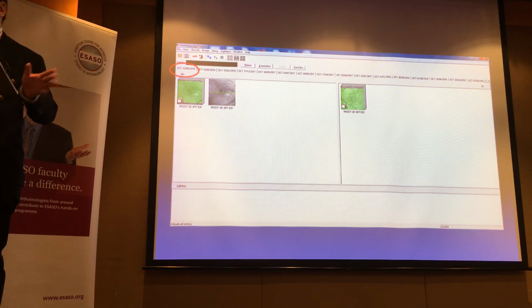Something's not right. Incidentally, in that case, for that patient on that day, because she was on a PRN, when she went for a scan, there was no fluid. Right? So this was 1 month after injection. So she opted for PRN. So no injection. All right. So that's the difference: inject versus don't inject. Imagine that. And can you imagine if I had injected her, if she hadn't known better? Well, I could have said, first of all, my clinical impression was no disease activity, no OCT scan. Then the question could be, why did you inject her, right? So that's one of the things to be careful about.